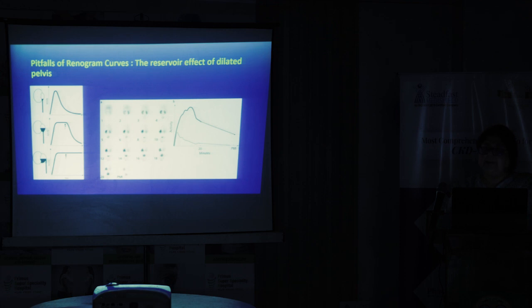Okay. Now each of these images is a 1 minute image. So you can see this is about a 21-minute study, and each of these images is acquired for a period of 1 minute. So every 1 minute you get one picture, which is the stacking of pictures which have been acquired over the last 1 minute, and these 1 minute images are stacked together to create this kind of a dynamic image. So every minute you have one stacked image, which is actually telling you the transit of tracer through the kidney in the last 60 seconds, right?